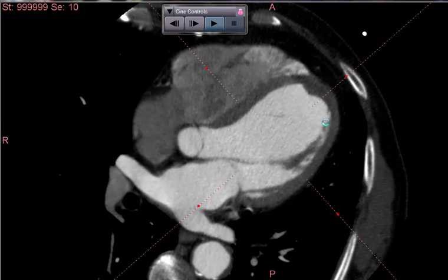So in this man who's had a prior bypass, he has clear evidence of a prior apical transmural myocardial infarction with apical dyskinesia and some akinesis involving the inferior septal regions of the left ventricle. Finally, he may well have a laminated left ventricular apical thrombus. If this cannot be confirmed, then further evaluation, including echocardiography, may be appropriate to further evaluate this area.